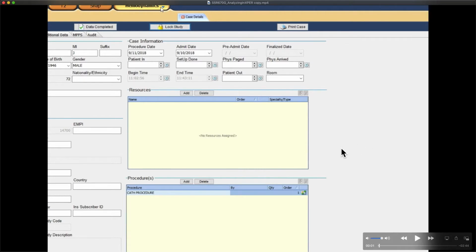Next, we're going to see how to select the appropriate best hemodynamic waveforms and data to get the correct calculation of the valve area. So in the workstation, we're going to go to hemodynamics and choose the condition. So for example, did you record it at rest, or did we do some kind of fluid challenge or other procedure?